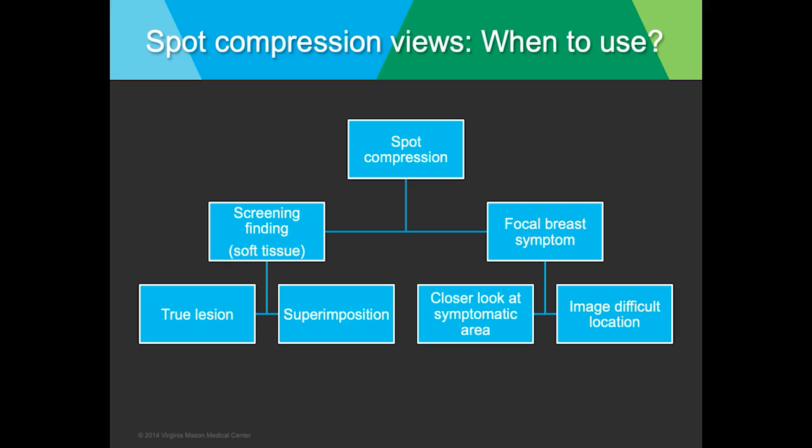Spot compression views are also useful for focal breast symptoms. You can take a closer look at the symptomatic area. You can also image difficult to image locations such as the far upper inner quadrant, the far lateral quadrant, and the axillary portion of the breast.